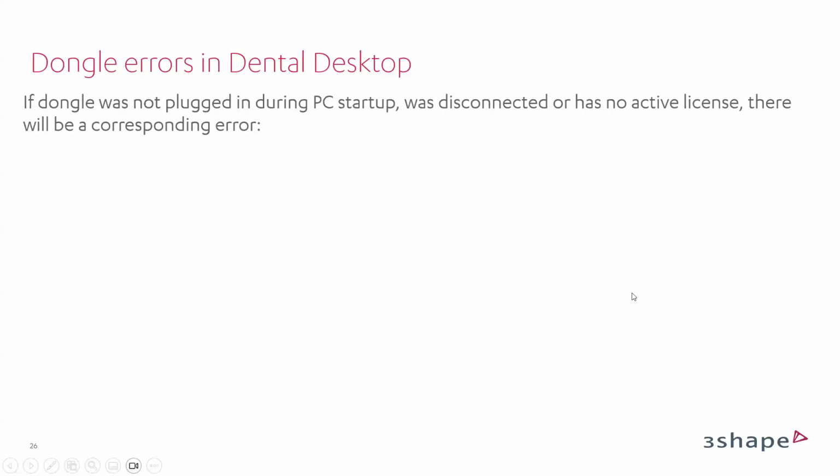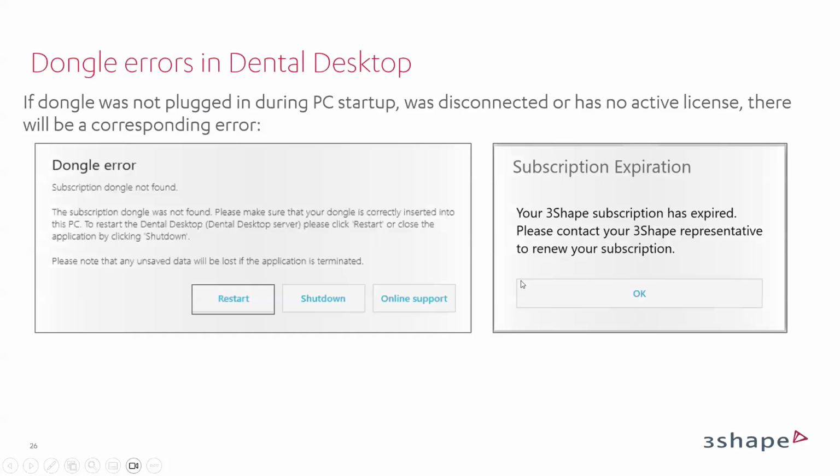Also, there is a common issue that our customers face, which is called the dongle error in our Dental Desktop software. It's when our dongle wasn't plugged into the PC during the startup, it was disconnected, or has no active access, there will be a corresponding error like this. So we call it the dongle error.